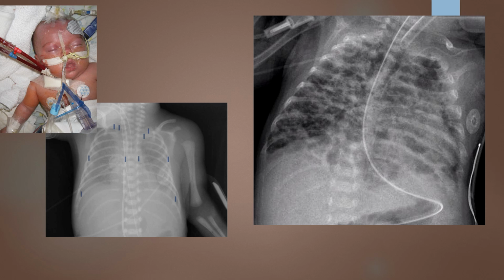And so there is not a lot of mid-coronal tilt here to be recognized. That would also indicate that our central ray angulation is appropriate. Mid-sagittal plane is relatively perpendicular. We already looked at the problems that we saw with the mid-coronal. That applies to the mid-sagittal, and the mid-sagittal is not tilted. It is well in line with the image receptor.